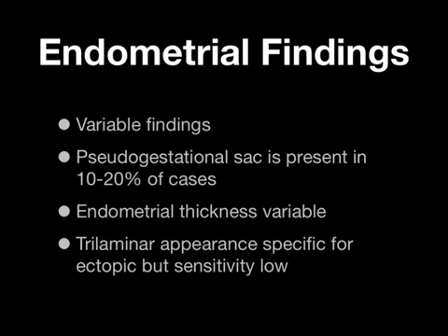However, a trilaminar appearance of the endometrium is highly specific for the diagnosis of an ectopic, but the sensitivity is low, so if you see it, this should point you towards the diagnosis of an ectopic pregnancy.